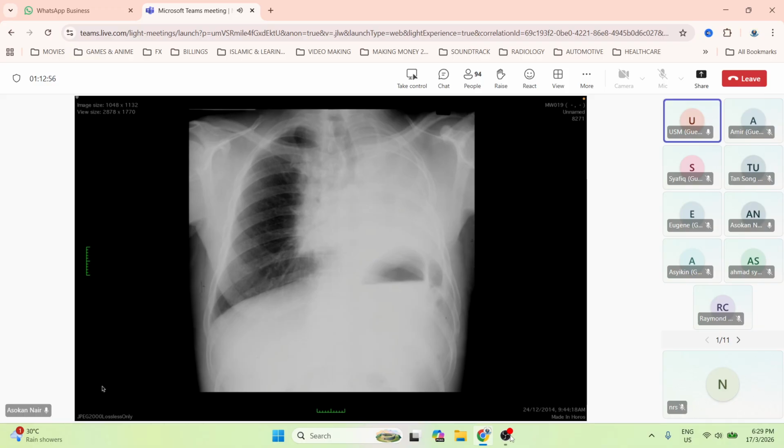Prof, I want to add that there's an absence of a rib actually. Yes, now you're getting warm. So what is this due to? Because this is a posterior rib that's missing, it could be a posterior mediastinal mass actually. Oh, no. What else? A rib missing there means what else can it be? So what else can cause the loss of volume? Oh, it can be pneumonectomy. Yes. Okay, so this is a pneumonectomy.